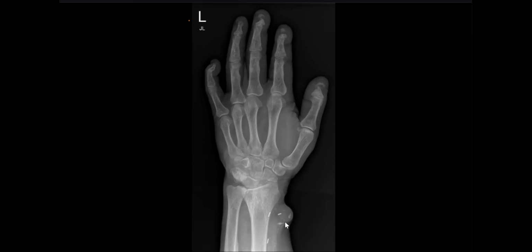It is the same pathology: swelling with calcification, swelling with metallic densities. Together with these findings, the diagnosis will be secondary hyperparathyroidism. What type of acrosteolysis is here? This is band-like, mid shaft acrosteolysis. It is unlike terminal tuft; maybe here terminal tuft and here mid shaft or band acrosteolysis. It's suggestive of hyperparathyroidism.